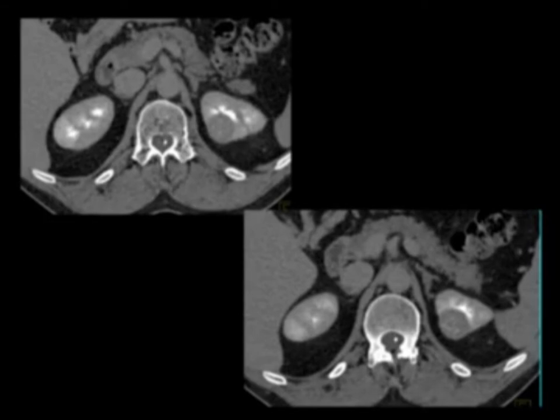Is that possible? Well, one rule I have, and this is something we haven't written, is if something changes from arterial to venous by more than 20 Hounsfield units, then you're thinking about a typical tumor. But people don't focus on the other part: what if things don't change? What if the arterial, venous, or delayed phases are exactly the same density? Well, in those cases, you're probably dealing with a high-density renal cyst. If you have a real tumor, whether it's hypervascular or hypovascular, you're going to see substantial change of more than 10 or 20 Hounsfield units. So indeed, that can be very helpful to you.